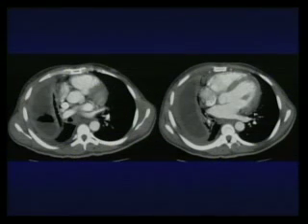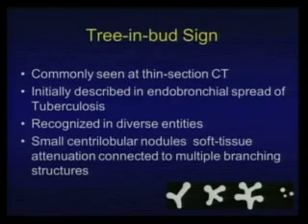This is an HIV patient with fluid, with an air fluid level. There is a thickening of the parietal and visceral layer with enhancement, and this is the split pleural sign in a patient with empyema. On the other hand, we have this other split pleural sign with thickening of the pleural layers, enhancement with contrast material, but the patient had had a cancer in the right lung. So you can see the split pleural sign in cases of empyema or exudates, not transudates.